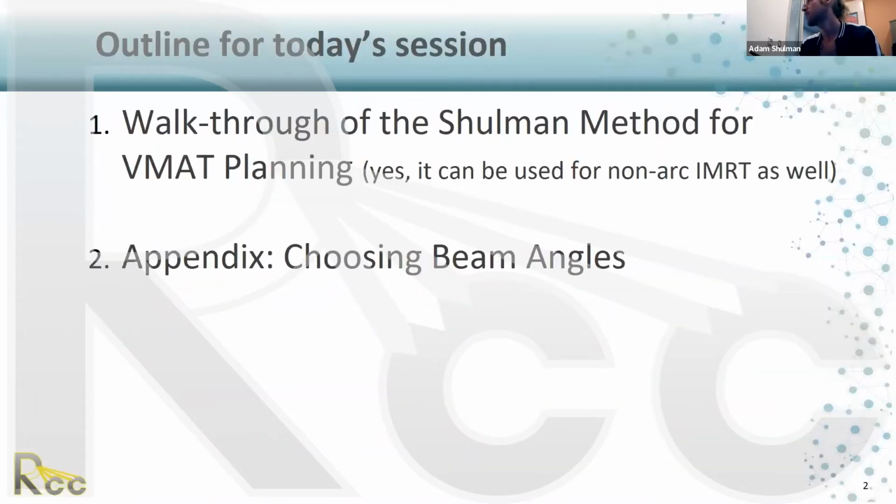I don't really have much of a PowerPoint presentation. I'm really just going to be sharing my screen and going over the document that we've created, as well as tutorials in my Eclipse treatment planning system. It's important to know that these are vendor non-specific, so the same principles can be used on any treatment planning system. I'll be demonstrating in Eclipse because that's what I have, but we can follow these same principles and get perfect plans on any treatment planning system.